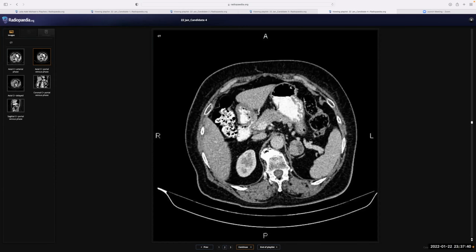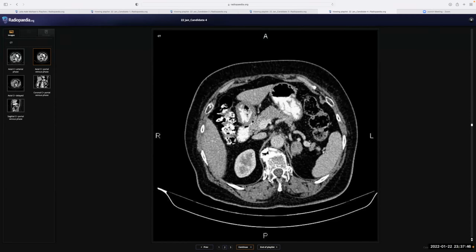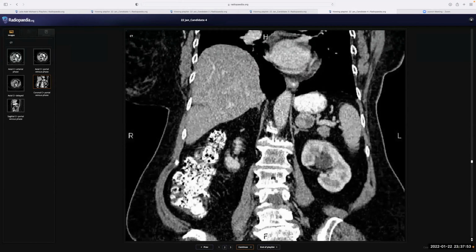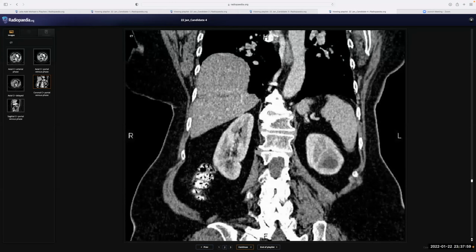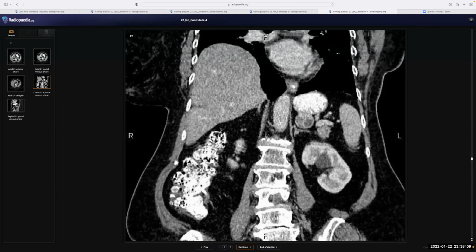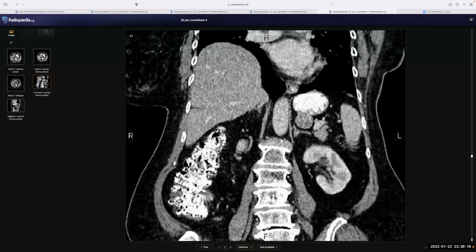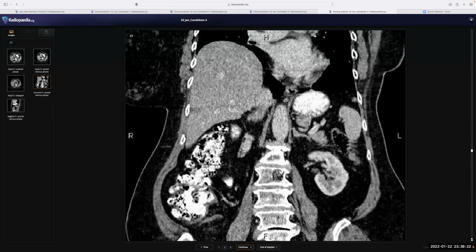No, this is not, this is renal. Would like to confirm it on a coronal section, if you allow. Okay, sure. This is abutting the left adrenal, lateral limb of the left adrenal, but this is not arising from the left adrenal. This mass appears to arise from the gastric wall, but it is an exophytic lesion to the gastric wall.